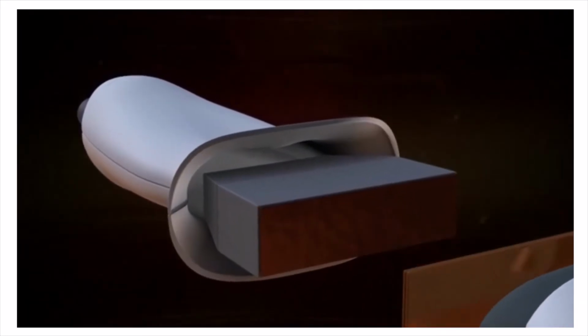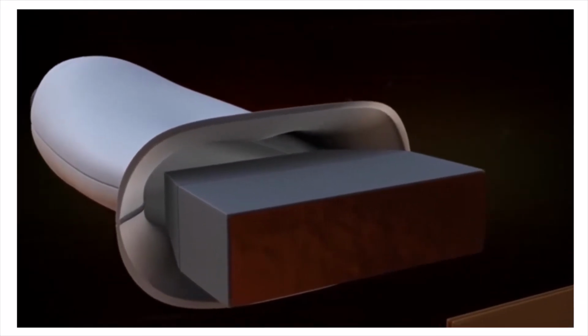The heart of most ultrasound systems is a device called a transducer, which uses an array of piezoelectric crystals. A piezoelectric crystal vibrates when an electric signal is applied, producing high-frequency sound pressure waves, which we call ultrasound. More importantly, this type of crystal can also work in reverse. It can produce electrical signals when it detects high-frequency sound pressure waves.